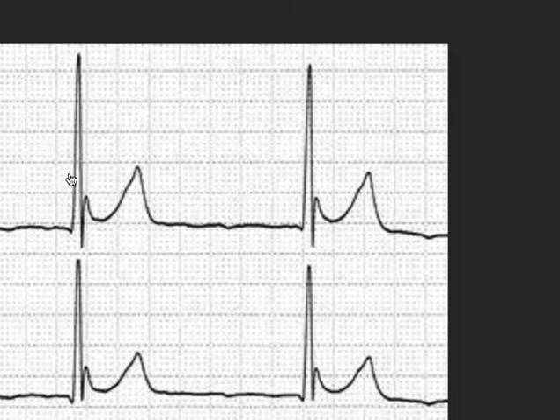But they can also be seen in patients who have high levels of calcium in their blood or in brain injury. But the most important thing, this question can be asked of undergraduate students in just one context: if you say hypothermia, that's enough. So this is how Osborne waves look, or this is how hypothermia looks.